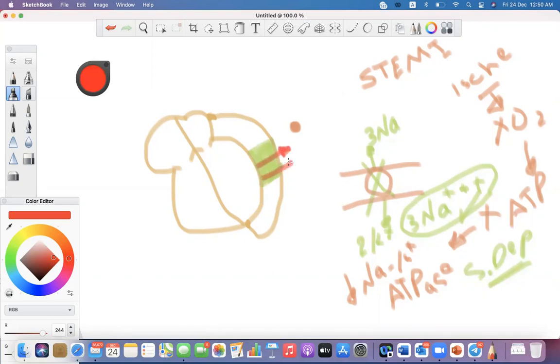As you know, the electrical activity moves from the endocardium to the epicardium. So it moves towards the electrode, which is here V5 or V6, causing ST segment elevation. As we have mentioned, when the electricity comes toward a certain lead, it produces a positive deflection. So here we will produce a positive deflection causing ST segment elevation.